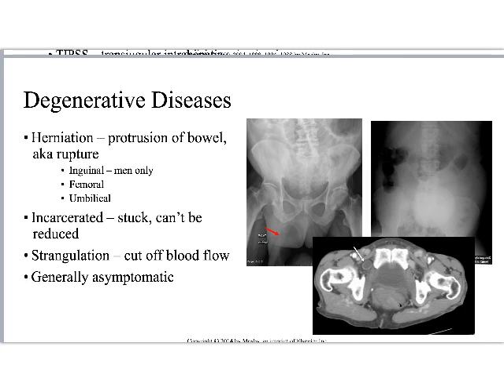The femoral and umbilical can be guys and girls, both. The femoral one is the CT image. I had a hard time finding an x-ray image of a femoral one, but you can see it's there between the femur and the bones of the pelvis. There's a little pouching of bowel, probably small bowel, into that area. That sounds very painful to me too, right? Finally, umbilical is in the area of the umbilicus. And the last image here, I don't know if this is barium or what, but we have this giant circle here, which is an umbilical hernia. Sorry about that.